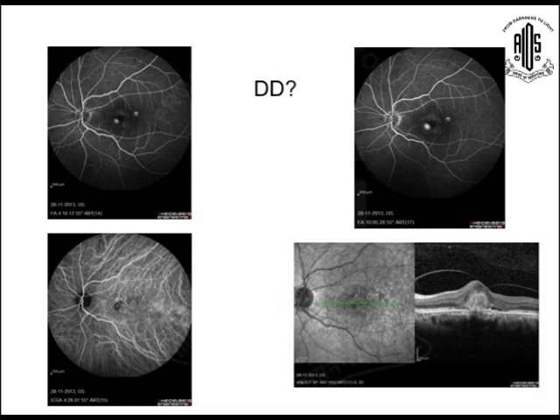And this is the DD, and see, in a simple smokestack leak. Okay, smokestack leak in the CSR here. And the patient's age was 66 years, so we went for the ICG. And we found, see, this is nicely hidden pathology. This is the PCV, polypoidal choroidal vasculopathy. This is the leak, and this is the RPE breach, and these are the dilated choroidal vessels here.